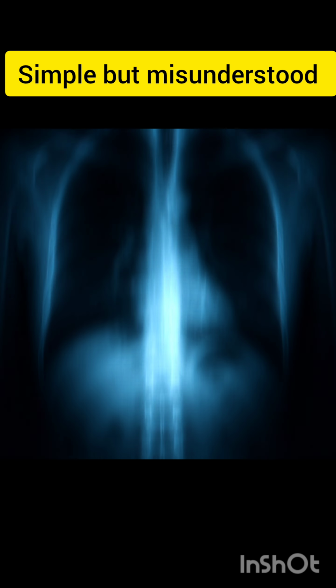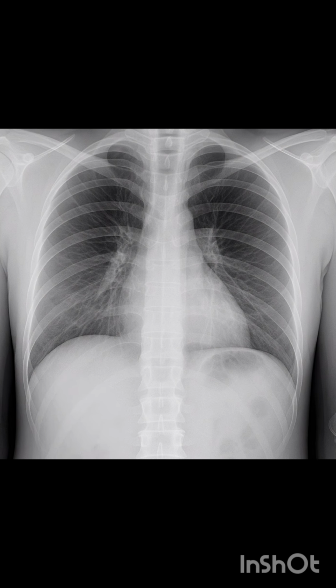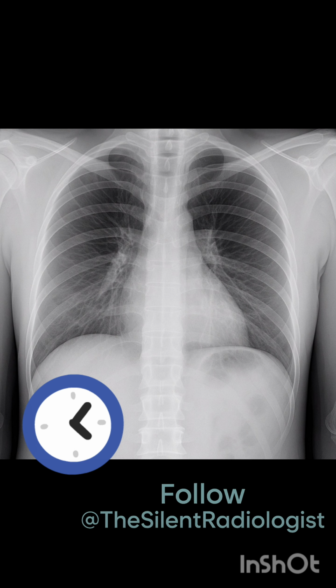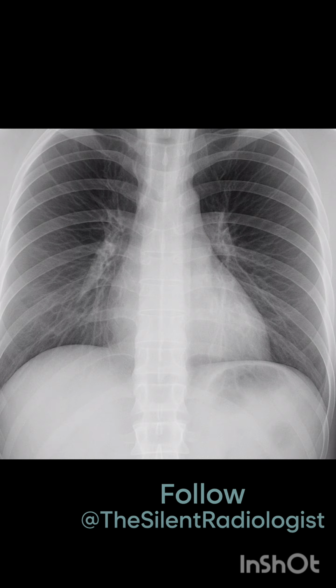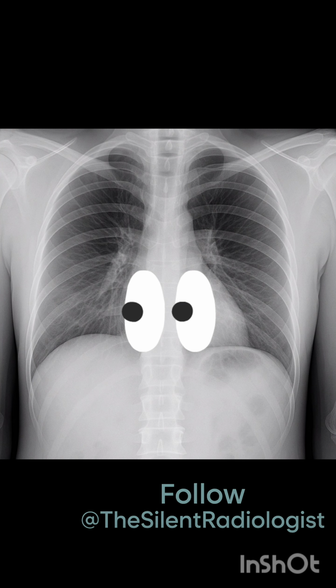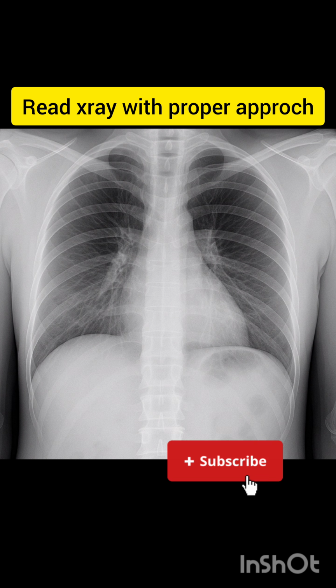Chest X-ray is the most common yet most misunderstood investigation. In the next 4 minutes, I'll make CXR interpretation simple, fast, and unforgettable. Every doctor must know how to read a chest X-ray, but the key is a structured approach.